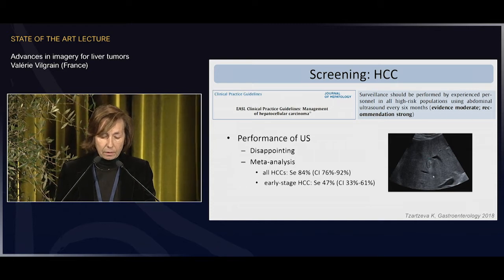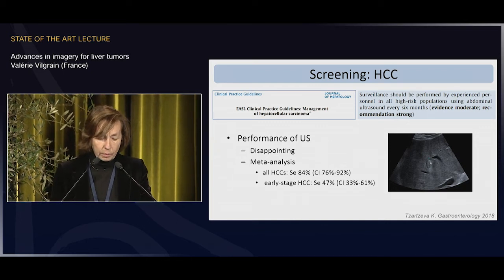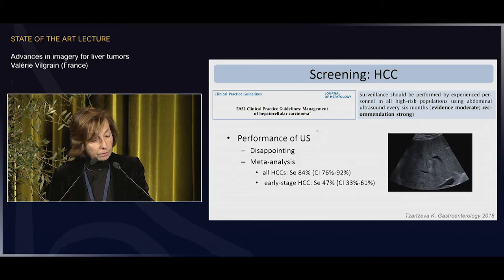And this is an example of the benefit of a surveillance program, where we can see here a small-sized lesion that turned out to be HCC. However, if we look at the diagnostic performance of ultrasound, it is rather disappointing.